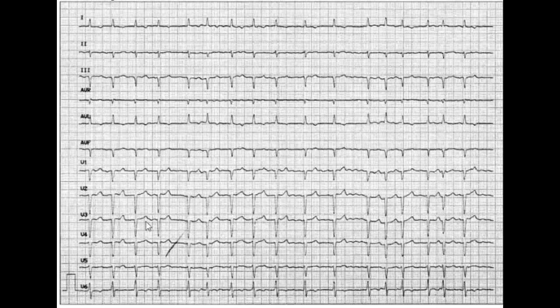And we see it also in lead V1, V2, V3, and V4. And as we mentioned before, lead V1 and V2 are the septal leads, and V2, V3, and V4 are the anterior leads. So it's chronic myocardial infarction in the anterior septal leads. So far we discovered two pathologies, which is atrial fibrillation and a scar after myocardial infarction in the anterior septal and the diaphragmatic leads.